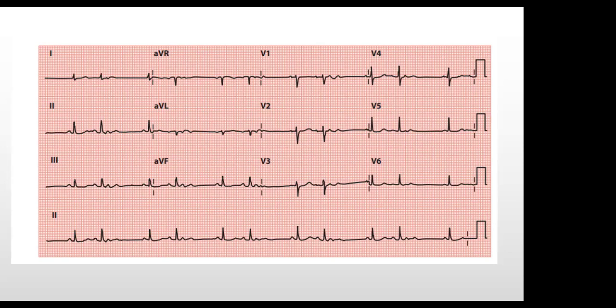That just tells you that this is Mobitz type 1. But if you are dealing with atrial complexes or atrial bigeminy, you don't expect to see that prolongation.